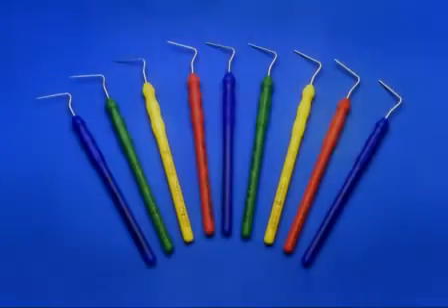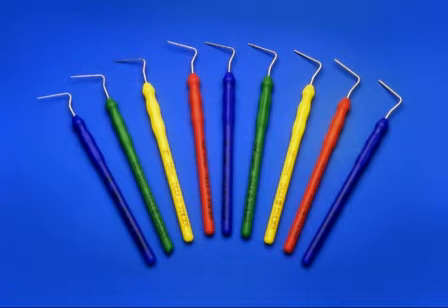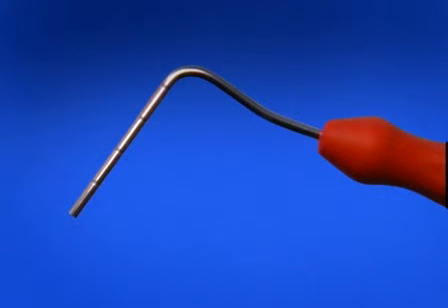The Schilder pluggers are selected for the warm gutta percha with vertical condensation technique. There are 9 instruments in the set, and the series ranges from the smallest, plugger size 8, to the largest, plugger size 12. Additionally, the pluggers have reference lines at 5 mm intervals, enabling the clinician to know the depth of the plugger in the root canal system at all times.